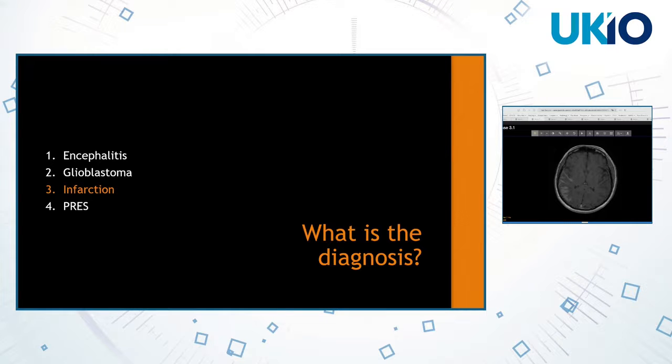So in this case, this is infarction. So that's where the majority of the votes have suggested as well. And indeed, the unenhanced CT scan, the history all fits quite well. But it's that enhancement that's quite striking and can be a bit confusing. The suggestion of PRES, and the location is about right in terms of posterior, but this is much more cortical than you might expect PRES to be, and there was nothing on the contralateral side. So again, PRES, although asymmetric, tends to affect both cerebral hemispheres and is more vasogenic rather than cytotoxic edema, usually, although you could have a bit of both.